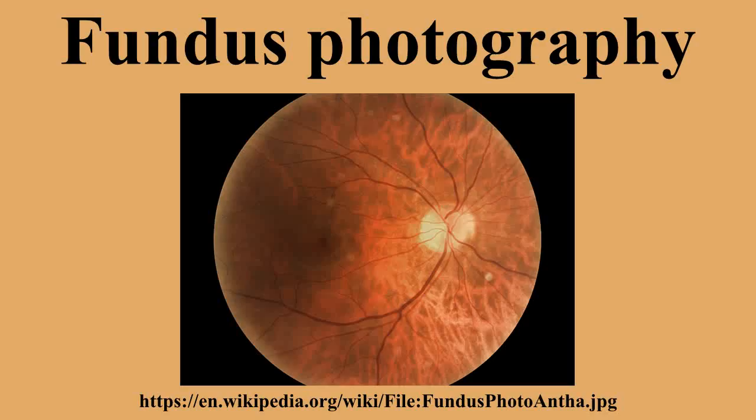However, some artifacts are not visible until the film is captured, and normally this can be caused either by a mechanical problem in the camera, the patient's pupil size, or the patient having blinked. The picture on the left represents a patient who blinked when the fundus photo was taken, resulting in a blurred and incomplete image of the fundus.